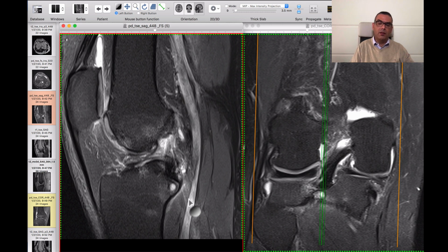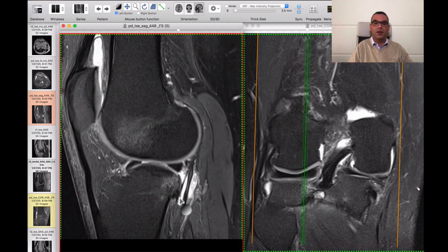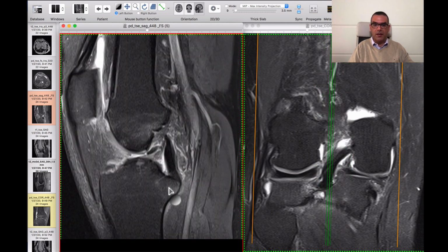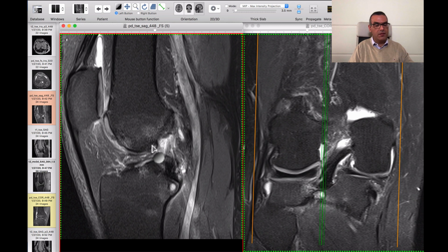So there is mild anterior tibial translation, and this correlates with the anterior drawer test the orthopedists do. You just flex the knee and pull the tibia anteriorly, and it comes anterior with you, and you can, of course, imagine how this happens. The ACL fibers are just completely torn and macerated, and the tibia is unstable.